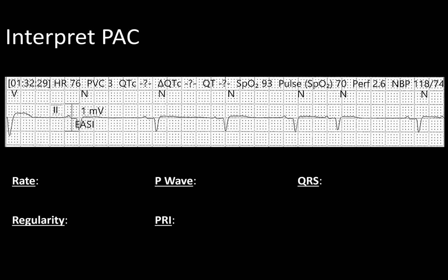So here's another opportunity to go through and practice this again. We have our solid mark right here, and right over there. And so I've got 1, 7 beats. Is it regular? Nope, sure doesn't look it because we have that narrowing between 5 and 6. So we're going to say irregular.